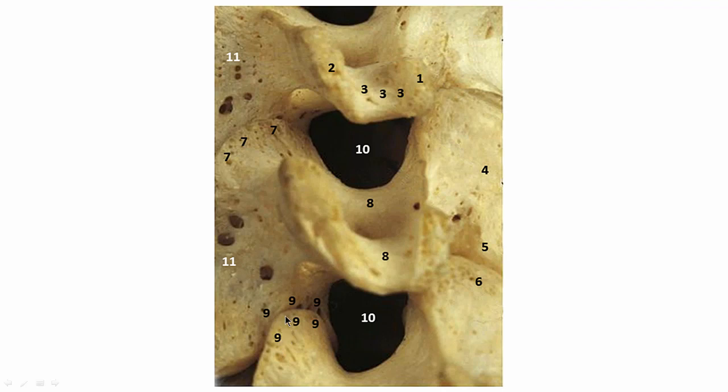Why are they important? Who cares about those? Here's another one, a broader uncinate process. Well, what's this thing, number 10? That's the intervertebral foramen, or the neural foramen, plural neural foramina. Look how close it is to the uncinate process. Remember, the nerve comes out of there, right? The spinal nerve, and for the most part the ventral ramus comes out of here.